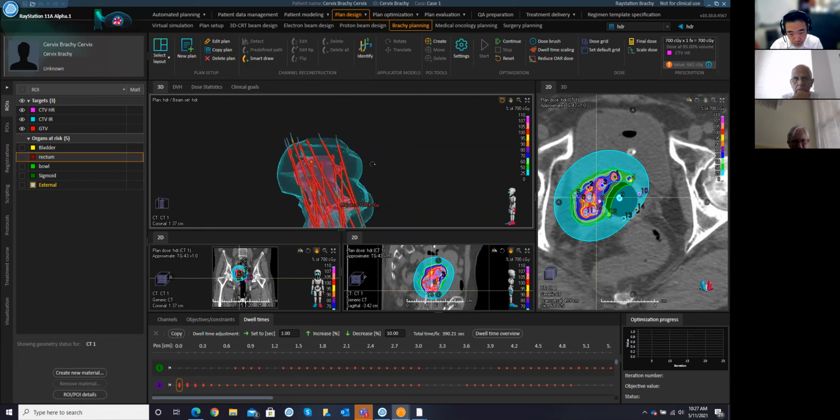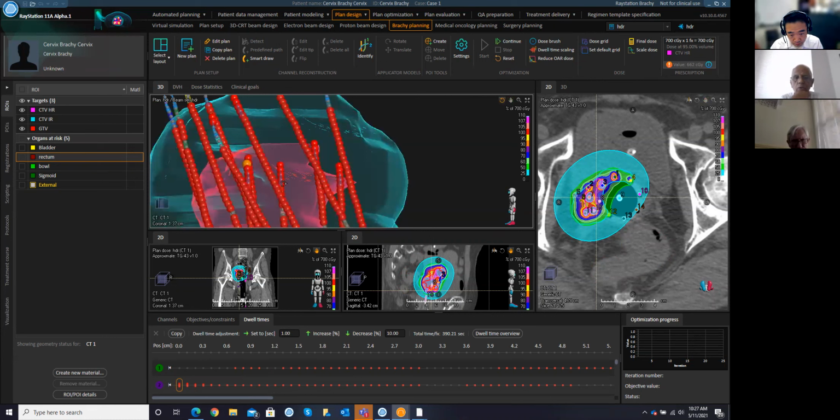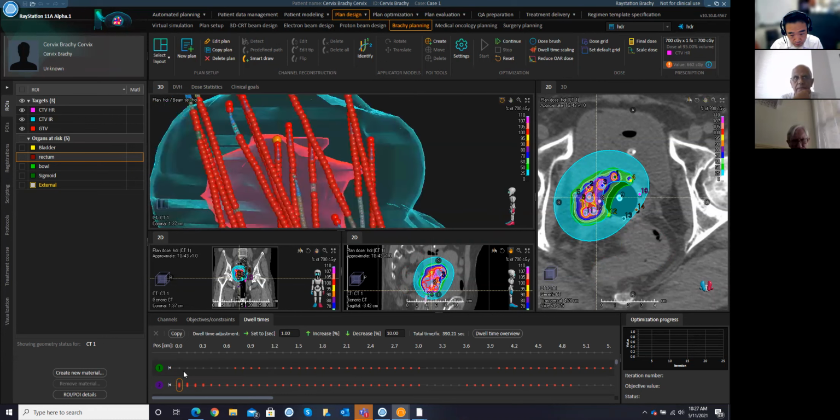Oh, you can define the start path there. Yeah, go ahead, Dan. Yes. So you only have one direction, so people can't go the wrong way by mistake. Is that correct? So you mean if you want to reconstruct starting from the other side?